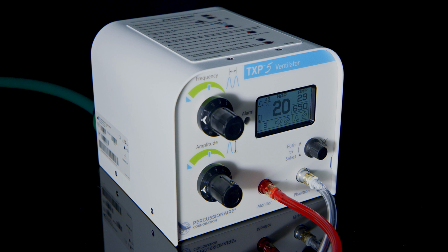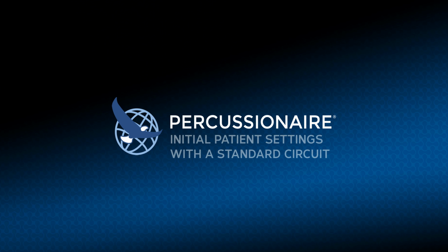Observe a smooth increase in pulse frequency to a rate around 650 pulses per minute. Observe mean airway pressure on display around 20 centimeters of water pressure. Rotate the frequency knob to arrow up 12 o'clock position. Rotate the amplitude slowly clockwise. Observe a decrease in amplitude until off at the full clockwise position. Pre-use check complete.